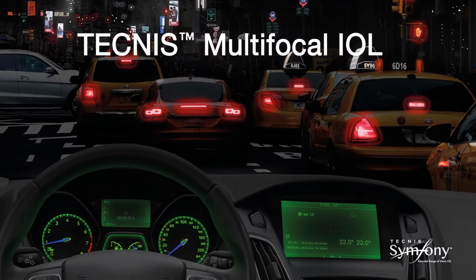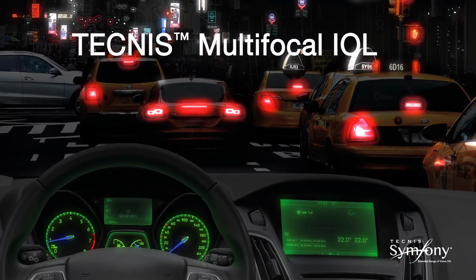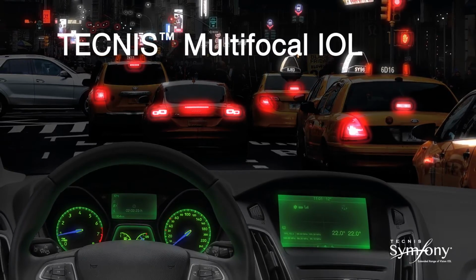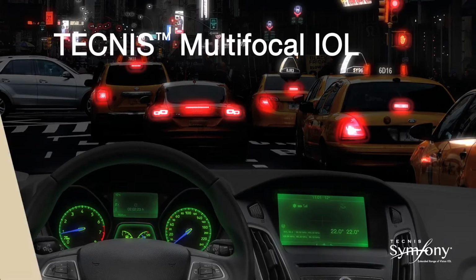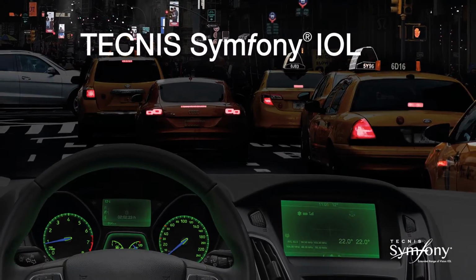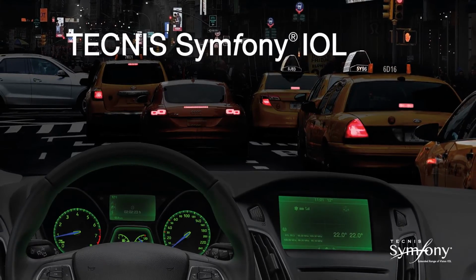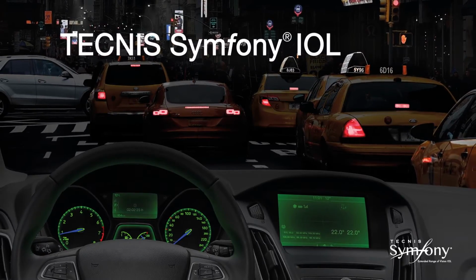In addition, because of the elongated focus, the Tecnis Symfony IOL does not have the distinct focal points of a multifocal IOL, and as such does not have the distinct out-of-focus images that can lead to halo and glare. As a result, the incidence of nighttime halos and glare is low.